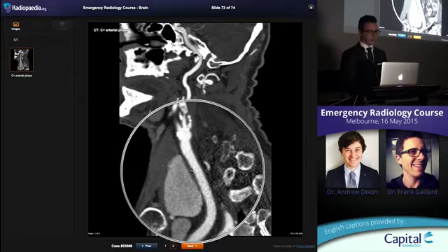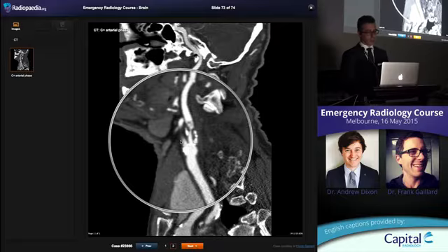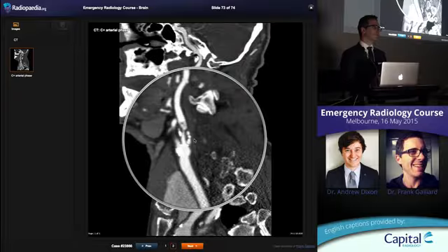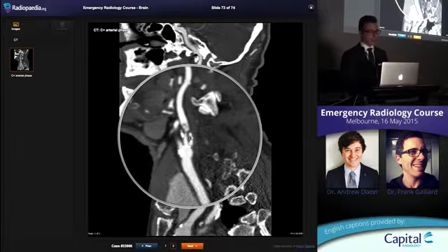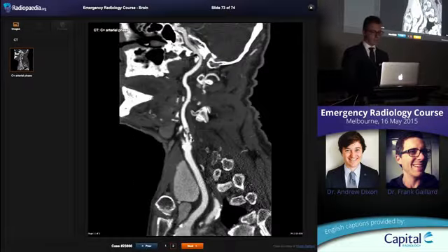So here's the common carotid artery coming to bifurcation, the external carotid branching off anteriorly and lateral, and internal carotid coming up with calcified plaque. CTA is very good these days at being able to look at the internal carotid artery for stenosis and is able to cope with pretty much any degree of calcification on modern scanners. So this patient, before they have an occlusion and infarct their hemisphere, you would like them to get some sort of therapy, and the therapy can either be carotid endarterectomy by the vascular surgeons or a stent placed by neurointerventionalists.